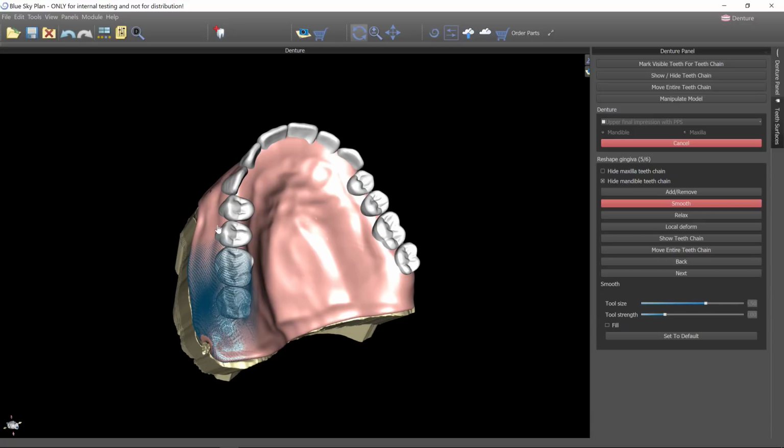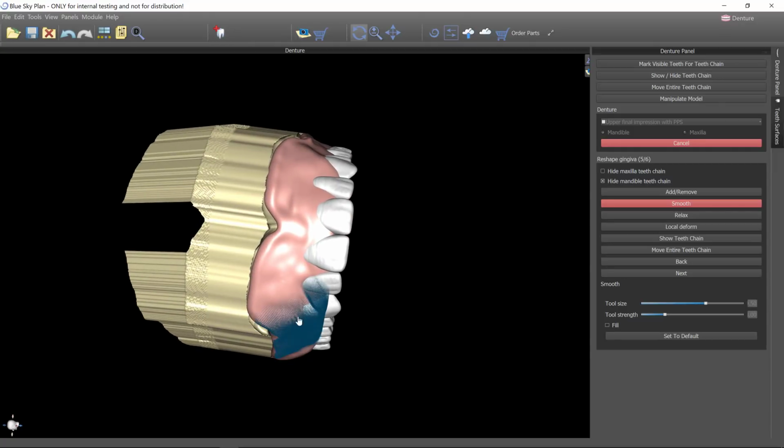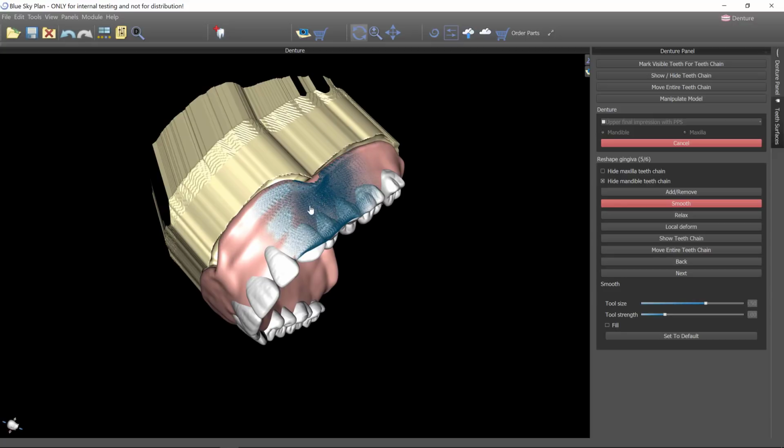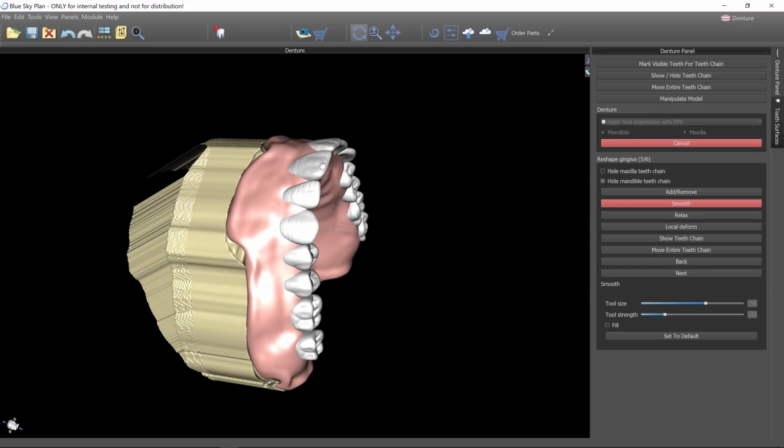So I think you'll find in all these workflows, there are some things that are just simply easier to do with a lab handpiece. I like sometimes to add gingival character by using things like Annex gum or gingival composites or acrylics, things like that. And so sometimes it might be worthwhile to actually pull the gingiva back, almost like a cut back, and that leaves you space to now do your characterization with those gingival materials.